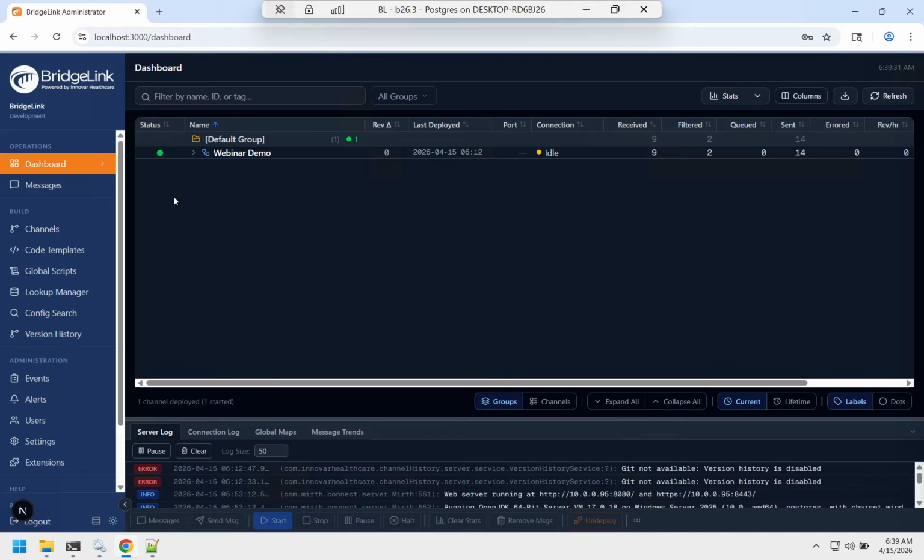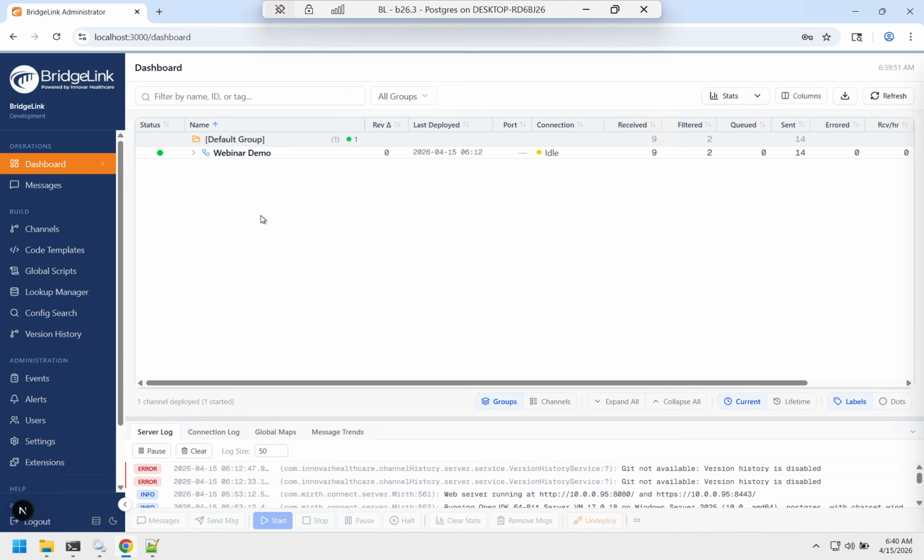So when you log in, you'll see a UI like this. Now, I do want to mention that this is a beta product, right? So some of the things we'll look at, the UI elements, colors, locations of things, that sort of stuff, you might see a little bit of variation there between this and the final product, but it's going to be something very, very similar to this. So right now I'm in dark mode. I'm going to flip this over to light mode for a minute. That's how most of us will start.